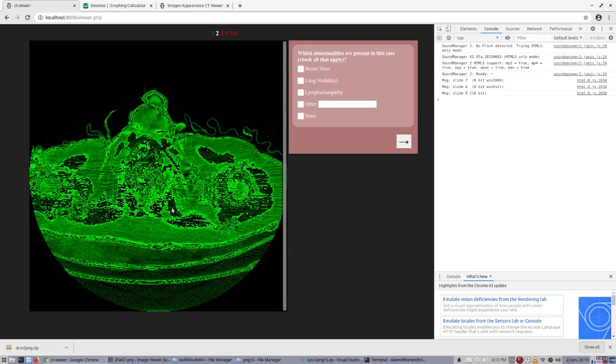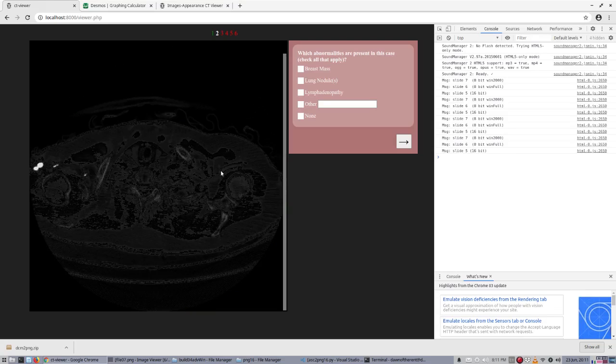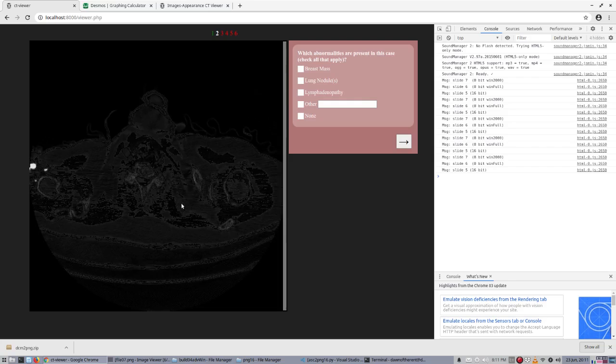Now start your server. I replaced files 5, 6, and 7 because pressing the 1 key alternates between these 3 files. Pressing the 2 key will generate shaders for these files, and as I press 1, it'll swap out the appropriate shader for each file as I come to it.